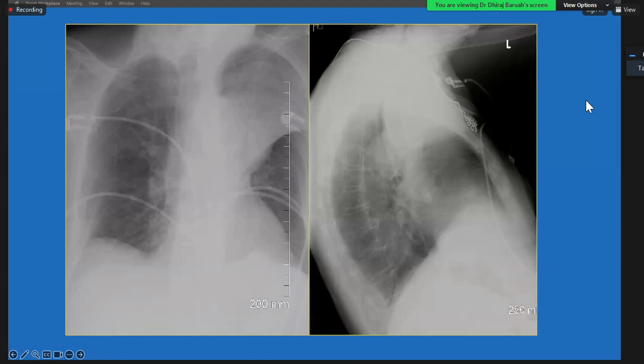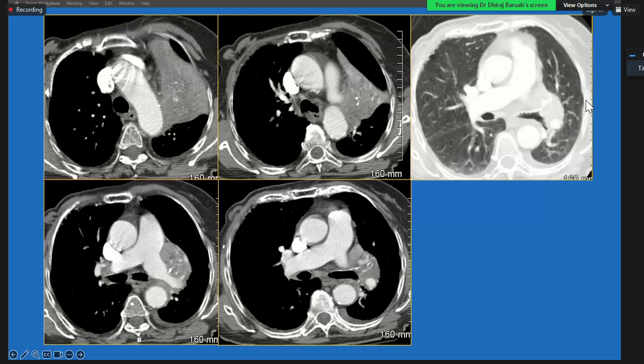So sometimes lobar collapse, like in this patient with total left upper lobe collapse and a hyperexpanded left lower lobe that goes really high, may not look similar to the one we saw before. It may not be all hyperdense or hypolucent, like we saw in the total left upper lobe collapse. I see this more frequently than the appearance we described before. So this was a patient with total left upper lobe collapse where the left lower lobe is really hyperexpanded and went high, and there was a central malignancy.